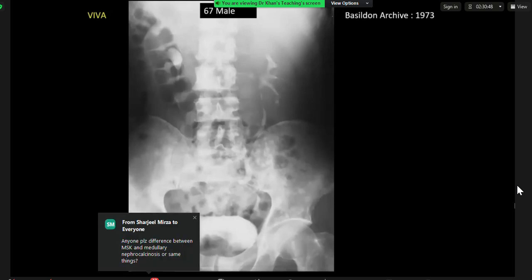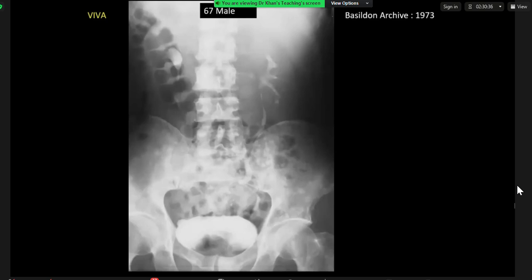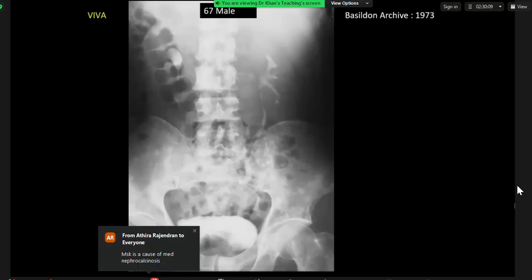Yep, so this is an intravenous urogram for a 67-year-old male. I can see an abnormality in the centre around the midline, just inferior to the bladder, which is causing a rounded impression of a filling defect on the inferior surface of the bladder. The bladder itself also appears slightly trabeculated with a lobular outline, and the collecting systems do not appear obstructed. So the trabeculated outline and the filling defect would make me suspicious of an enlarged prostate, possibly causing secondary outlet obstruction with chronic changes seen in the bladder.